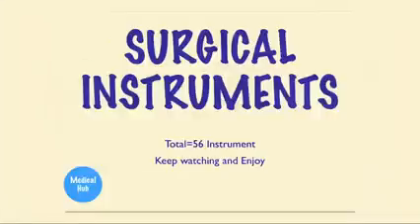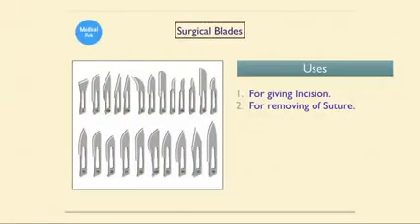Okay, so hello friends, today we will discuss about the surgical instruments. So we will discuss surgical instruments names and their uses. We will discuss a total 56 instruments. Okay, so let's start. So we will start with the surgical blades.